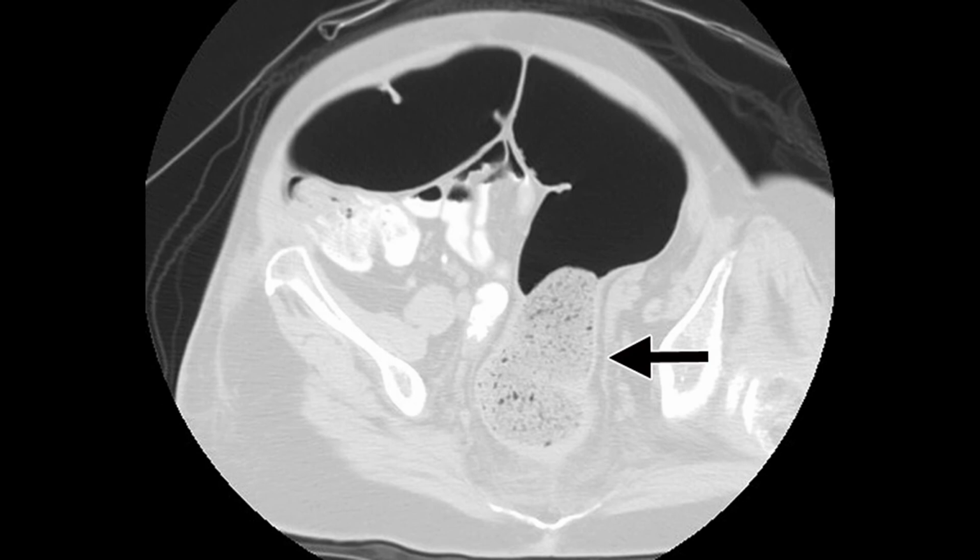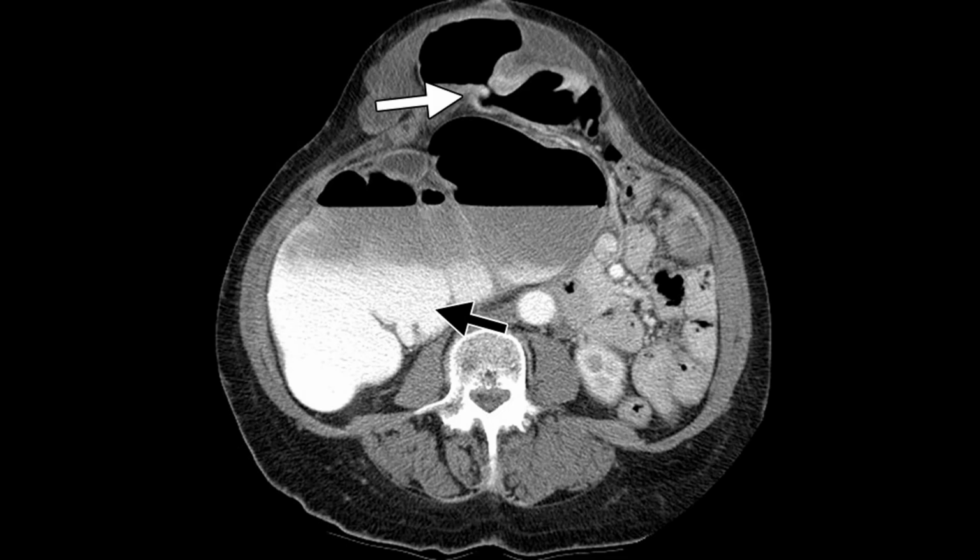So this is an example of fecal matter causing the obstruction, which is causing dilatation of the proximal bowel loop. This is a classical case of fecal impaction. It is very commonly seen in elderly patients, psychiatric patients, and dehydrated patients, and can present like an obstruction. This usually doesn't need surgical management, so it is very important to identify this.